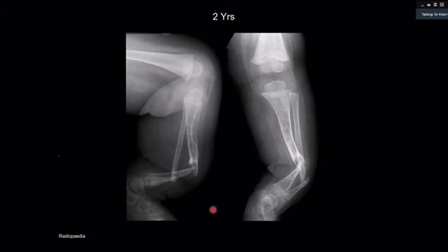Right. So first of all, let's go to your description, and you asked for other films, which is fine, but there was nothing on other films. This is not osteogenesis imperfecta, right? Mm-hmm. Second thing in your differential diagnosis was neurofibromatosis, and that is the correct diagnosis. You tell me why.